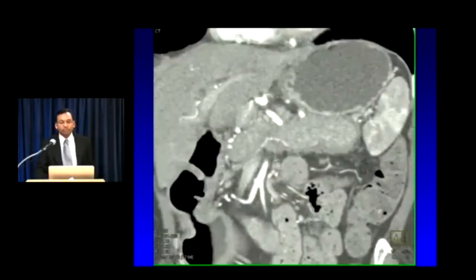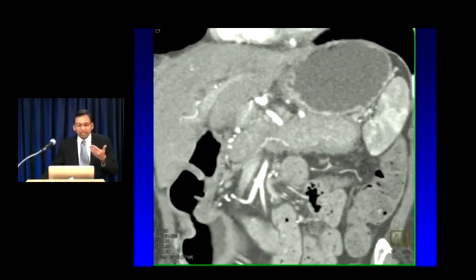Here's another example, big, boggy pancreas, and you'll hear the term sausage-like enlargement of the pancreas, which refers exactly to this morphology. Notice again that despite the size of the pancreas, the loss of fatty lobulation, I don't see much in the way of surrounding edema and stranding, so this probably isn't edematous pancreatitis. And to make the diagnosis, note that you see this rim, or halo, around the margin of the pancreas. This is classic autoimmune pancreatitis confirmed with an elevated IgG4.